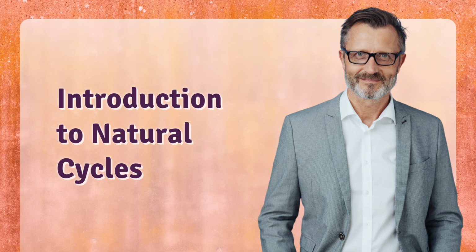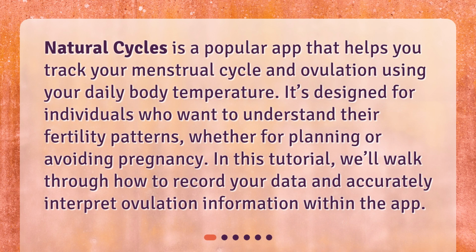Introduction to Natural Cycles. Natural Cycles is a popular app that helps you track your menstrual cycle and ovulation using your daily body temperature. It's designed for individuals who want to understand their fertility patterns, whether for planning or avoiding pregnancy. In this tutorial, we'll walk through how to record your data and accurately interpret ovulation information within the app.